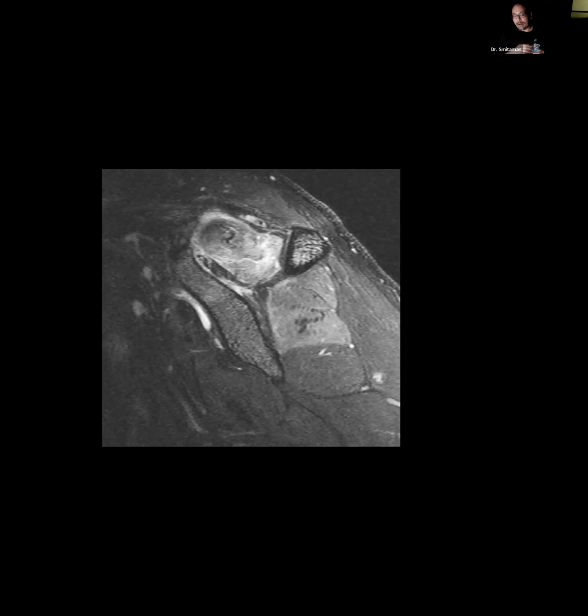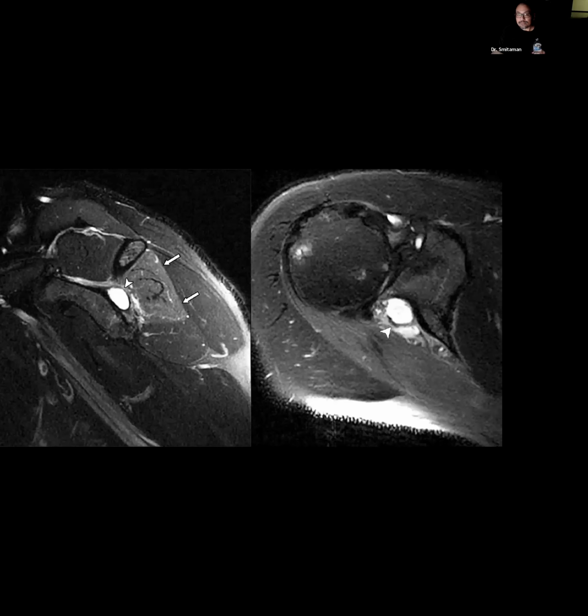I forget, I apologize. But this is a nice case of denervation atrophy involving that nerve root distribution. Acute denervation, okay, the muscle signal intensity changes can be visible in about 4 or 5 days, depending on who you read. Subacute, I like to call that when you still see this edema, but then you start to get wisps of atrophy or fatty replacement of the involved muscles.